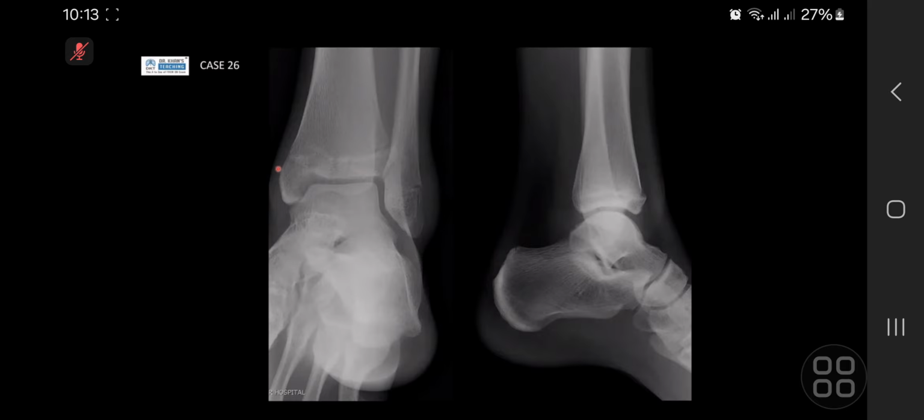Certainly on the lateral aspect, maybe you can say a little bit on the medial, just because, to my eye, they look a little bit more full compared to normal fat. But there's definitely more on the lateral side. So I usually take an eyeball, subjective measurement. So this is quite small and this is big, so you say more on the lateral side. Same goes for joint effusion. So you're seeing bulging of the anterior capsule and bulging of the posterior capsule. So there's a large joint effusion.